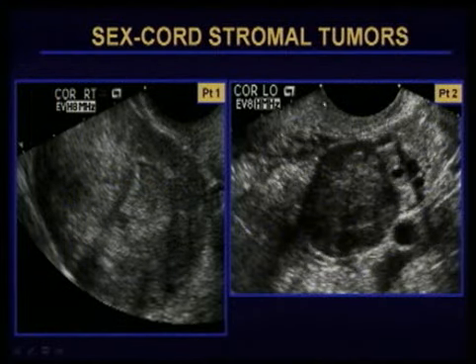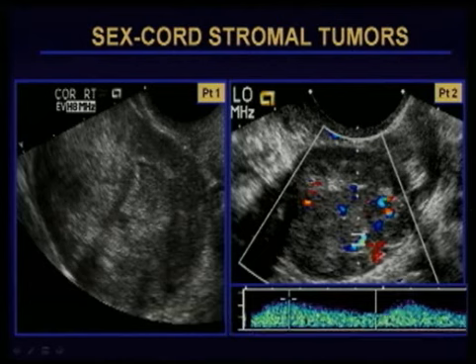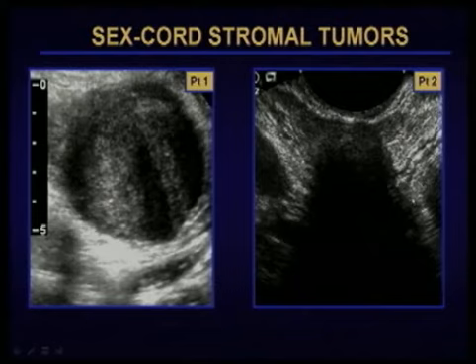What about these cases? 2 different patients with rounded, relatively small mass, larger mass in the ovary, with Doppler flow that is consistent with a neoplasm. Well, if you have these appearances in a woman, these don't look like normal ovaries. They are rounder than a normal ovary, and we do not see the follicles. These are patients who have ultimately proven stromal tumors in association with feminizing and masculinizing symptoms. So knowing if it's masculine or feminine in terms of their symptomatology and excess hormone can help you decide which it is. But overall, I let the pathologist give me the results of what these solid tumors are.